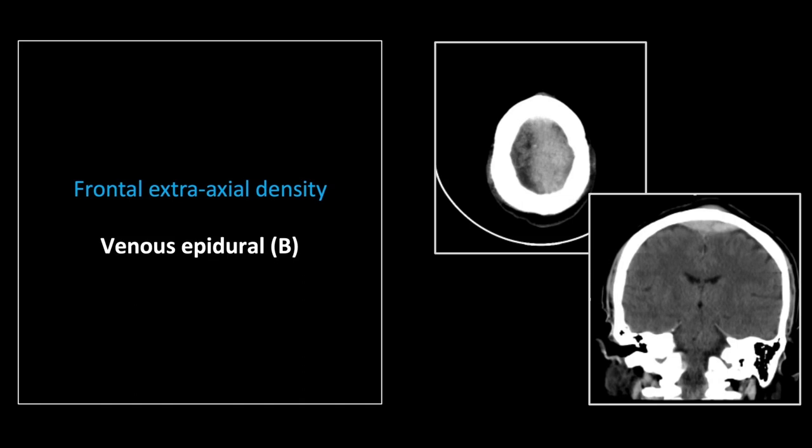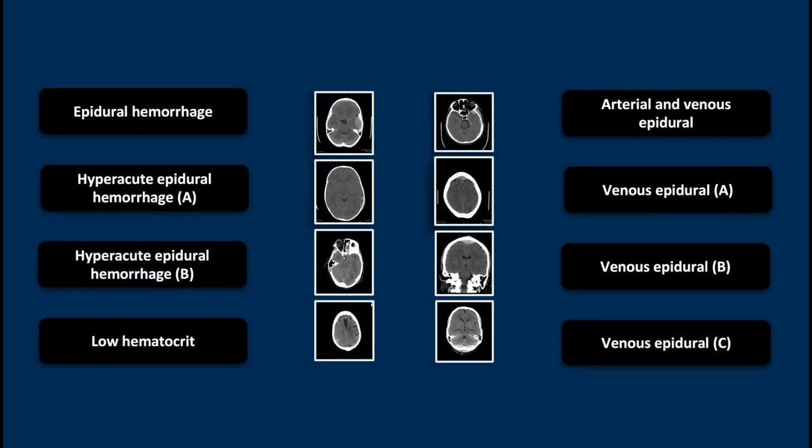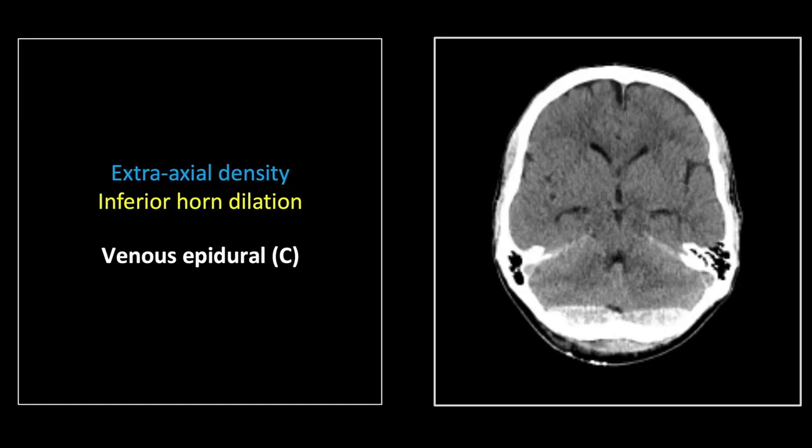This is, I believe, becoming the standard for all acute neuroimaging. Essentially, all of the facilities that we interact with are doing coronals on all of their head CTs.